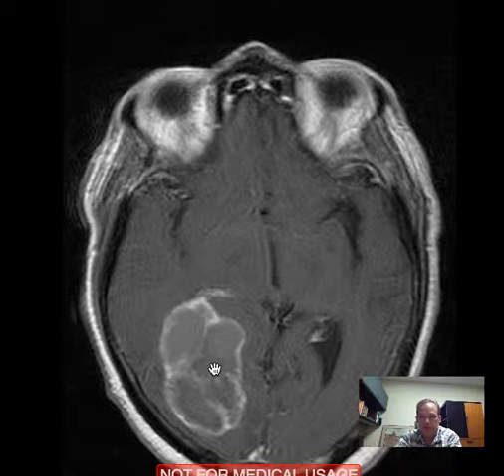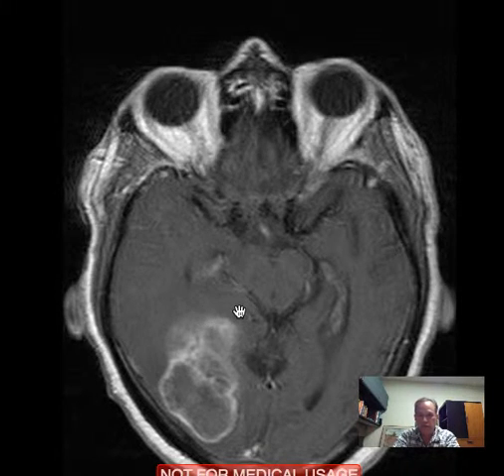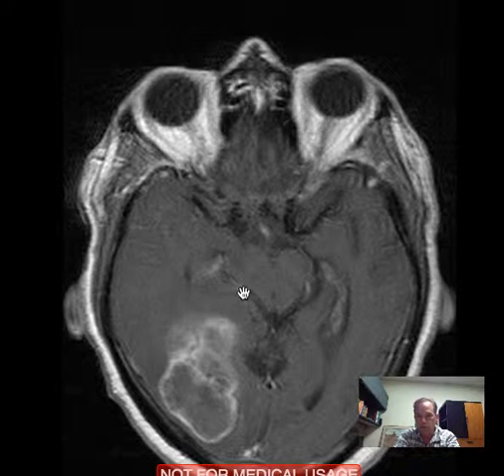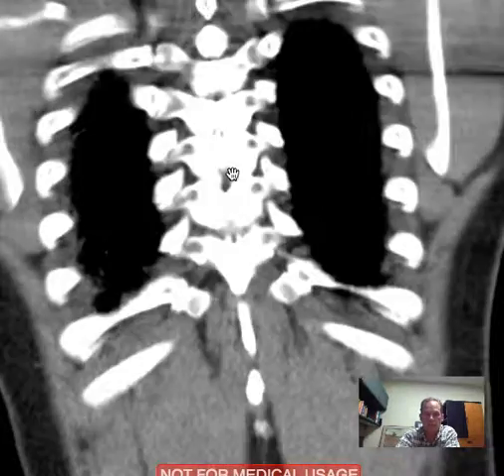So what we have then is a bronchogenic carcinoma, a left hilar mass that proved to be a metastasizing bronchogenic carcinoma to the brain, metastases to the brain. And there's some other interesting things here, like mass effect on the brainstem. You can see how it's pushing against the brainstem. But the primary matter here is that it's a pulmonary mass. It's evident in the hilar area.